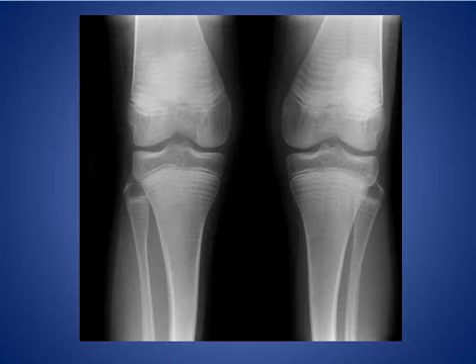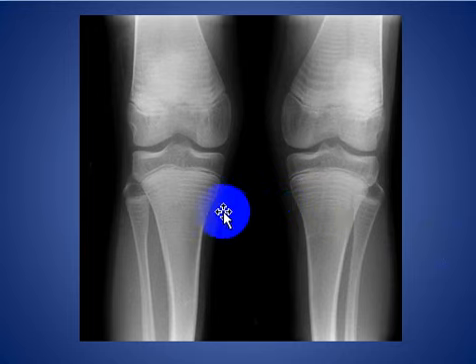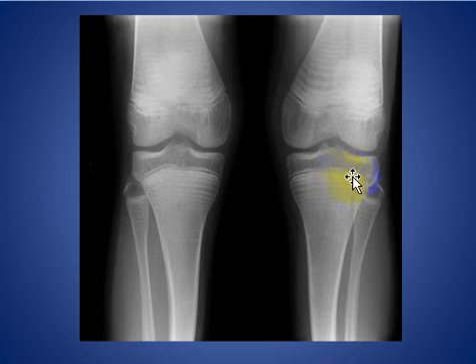And it is aneurysmal bone cyst. Here, this patient, we have zebra stripe sign, and this occurs in children with osteogenesis imperfecta treated with cyclical bisphosphonate therapy. And this case is from Radiopaedia.